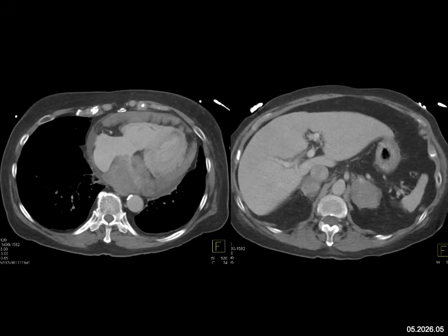It's not really a good look for lung cancer because I don't see a lung mass. Well, maybe it's in the upper lung zones. Lung cancer can involve the pericardium, but usually not this bulky appearance. And of course, lung cancer can easily metastasize to the adrenal glands. Melanoma is always something you consider, though pericardial involvement is less frequent. This does not have the look of primary adrenal carcinoma. That can be unilateral usually, but it's not going to involve the pericardium.